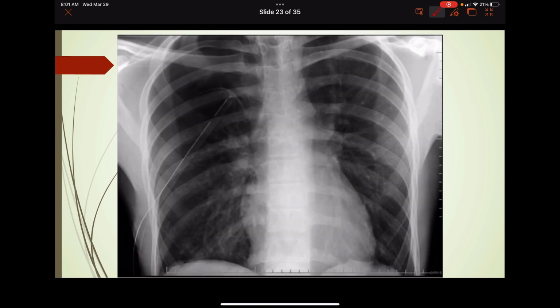There we go. So another chest x-ray, and here is trachea. Here's carina, my pen will work. Nothing in the trachea. B for bones. Bones appear to be okay. Here's this left side. C for cardiac silhouette. D for diaphragms. This film's kind of cut off a bit. Sorry about that. And E for everything else. We know there's something on this right side. Let's go left side just to make sure it's okay. It looks like lung markings all the way out.